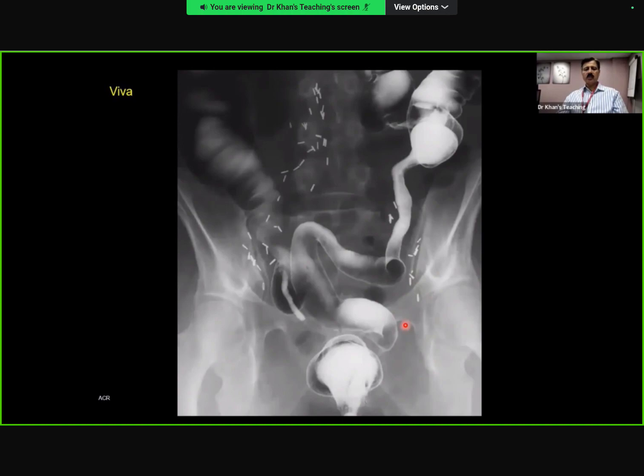Because they will show you as a story film, and you have to develop that story. And the story is that the patient had surgery. Usually, in large bowel, it is the sigmoid, the rectosigmoid, which is involved. Simple reason is that there are a lot of cancers in that area. In females, the gynae cancers. In males, again, similarly.